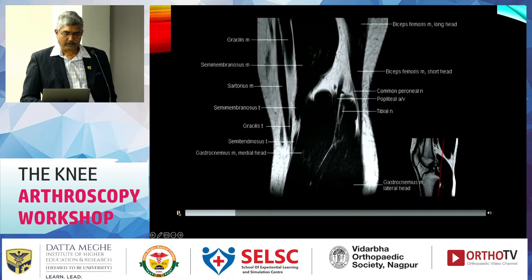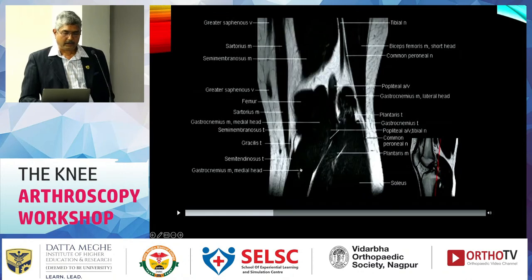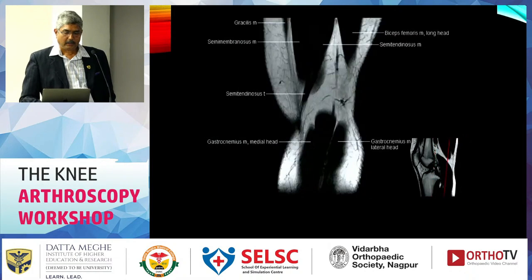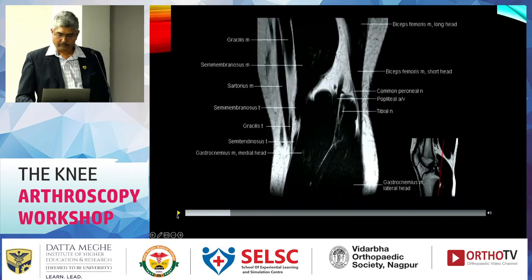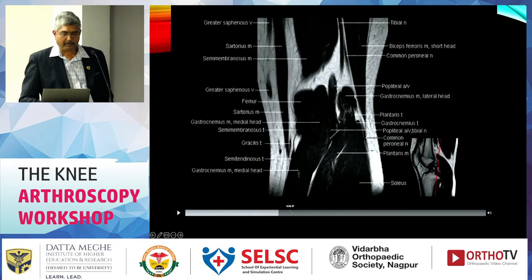Yes, I will stop here. So again, see here, sartorius. We have all these images on the medial aspect, the pes anserine bursa. Now started. Here, one by one we will go ahead.